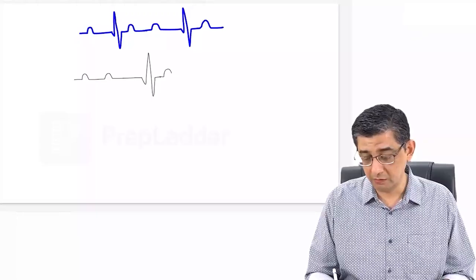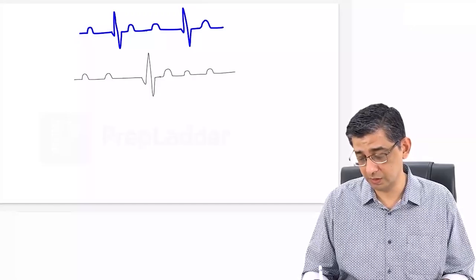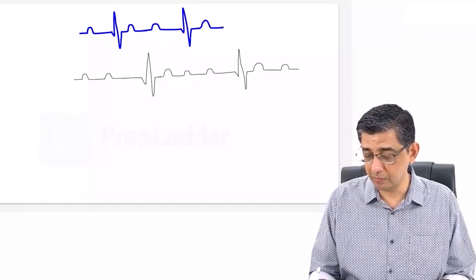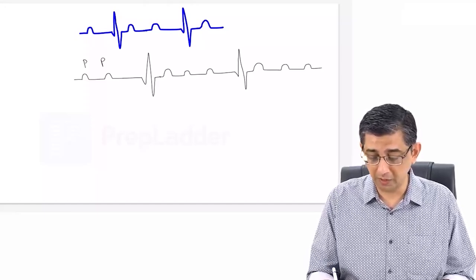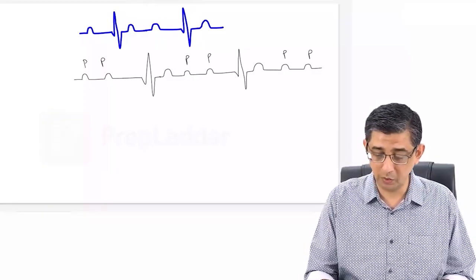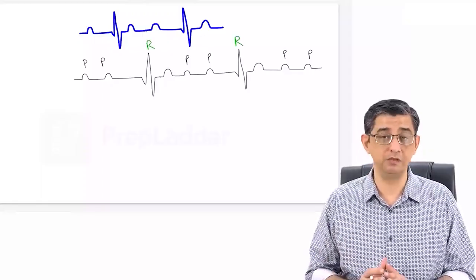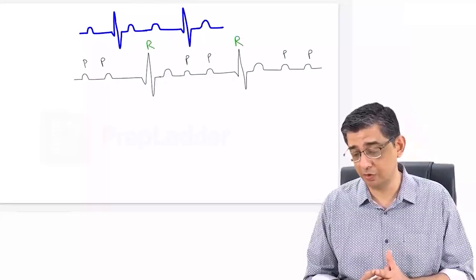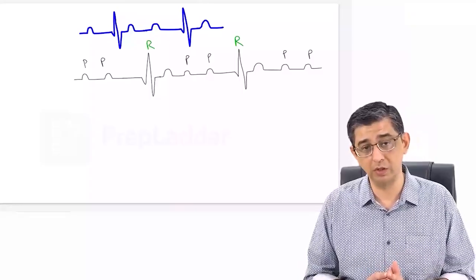You can then notice a T wave coming up, then after P again another P coming up. Then I'm waiting for the QRS complex, which is relatively broader. I'm sketching a T wave at the moment, again after P another P wave. Now if you look at the number of the P waves, or the number of times I've just said the word P, it is much more in number as compared to the R waves present in the ECG of the patient. So one thing that is very striking in this particular ECG is the disparity between the number of P's and the number of R waves or the QRS complexes. The duration of the QRS complexes is also broad.